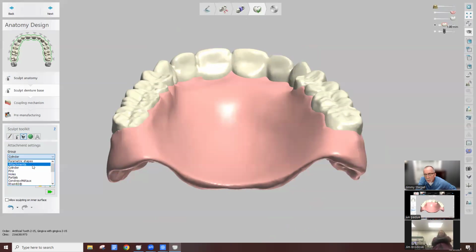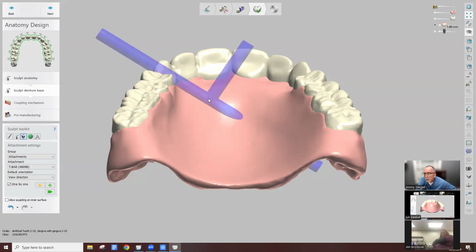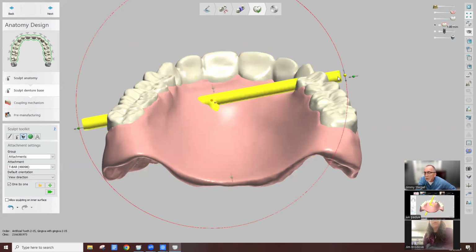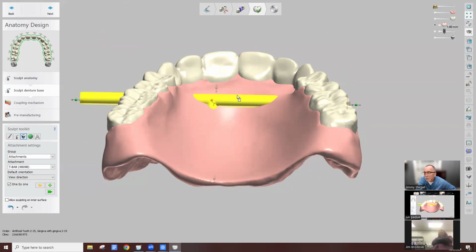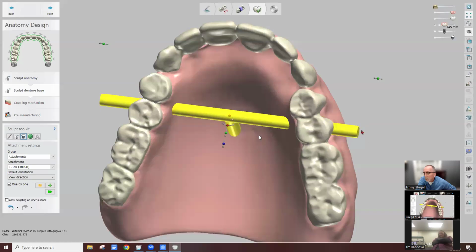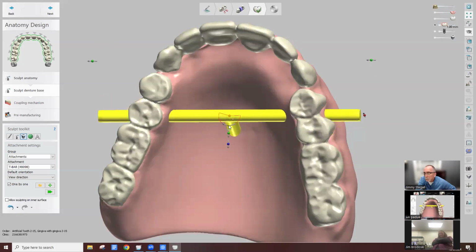And those are always fun, but ooh, always like view. No, it didn't work. That's the thing about this tool. I never can understand 3Shape's attachment tool, but lots of options here. And once you get used to this, it's pretty simple.